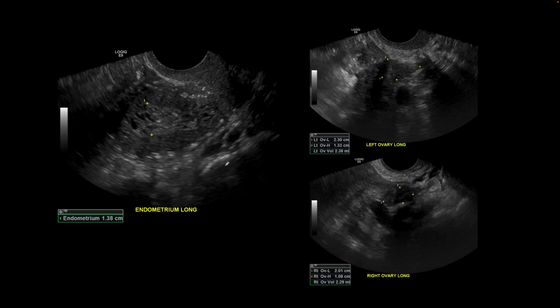Here's our next patient. They presented with postmenopausal bleeding, and we've performed an ultrasound of the pelvis. Here we are looking at the uterus, and this is the heterogeneous endometrium showing some cystic changes, which are hypoechoic right there. It is thickened, 1.4 centimeters in thickness, and on the right we have two images from their ovaries, which are very small. And so that goes along with their postmenopausal status. And so something like this should be biopsied to rule out an endometrial cancer. This turned out to be an endometrial cancer.